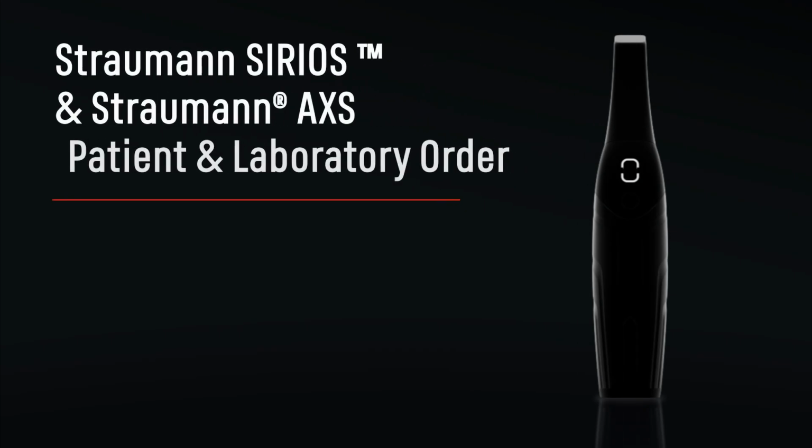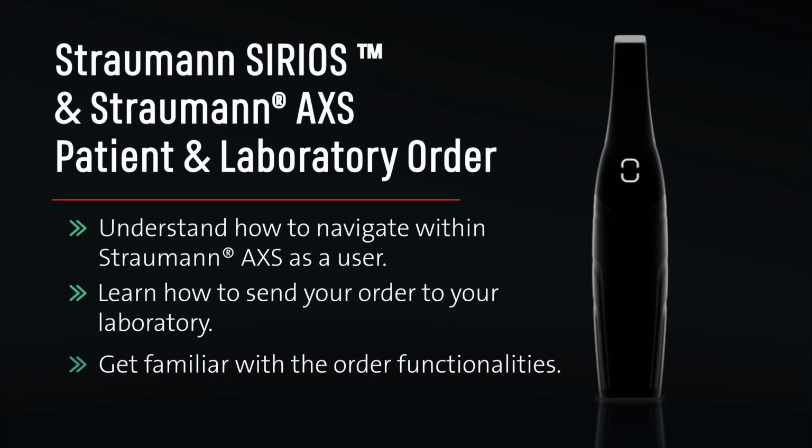Straumann SIRIOS and Straumann AXS patient and laboratory order. Understand how to navigate within Straumann AXS as a user. Learn how to send your order to your laboratory. Get familiar with the order functionalities.